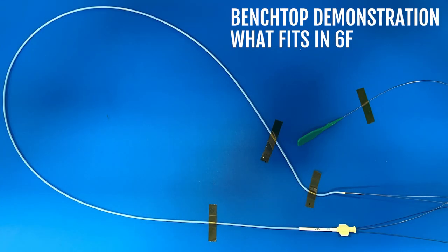Here we have a benchtop demonstration to determine what fits in a 6 French system. The setup is as follows. We have a guide extension sitting in the guide catheter and extending out the distal end. We have a first wire that extends parallel to the push rod into the guide catheter and out the distal end of the extension. We have a second wire that also extends into the guide catheter and out the extension, showing a parallel wire or buddy wire setup.